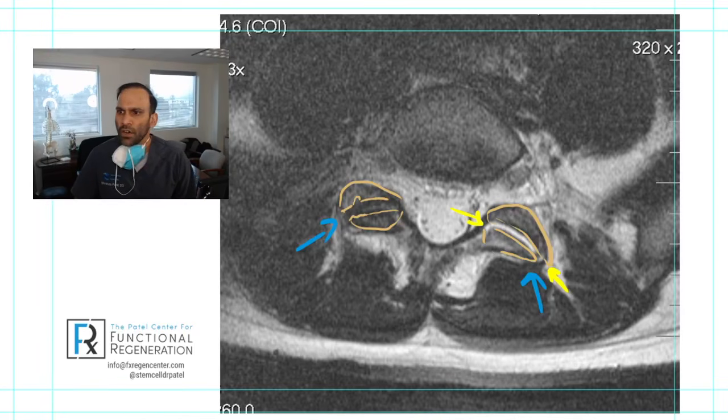Michael said that's why I said arteries show up as white circles. Some arteries show up as white circles, some as dark circles, depending on what exactly we're looking at.